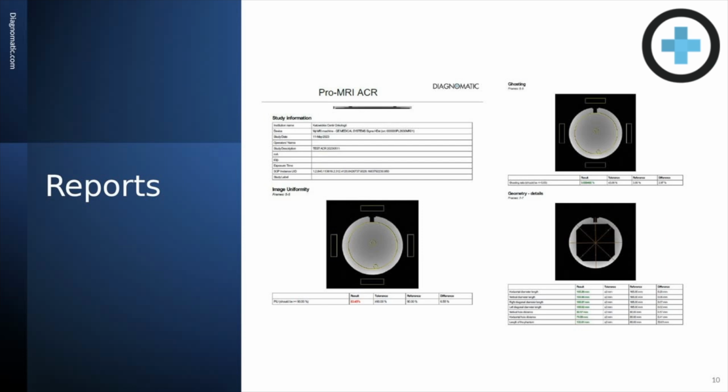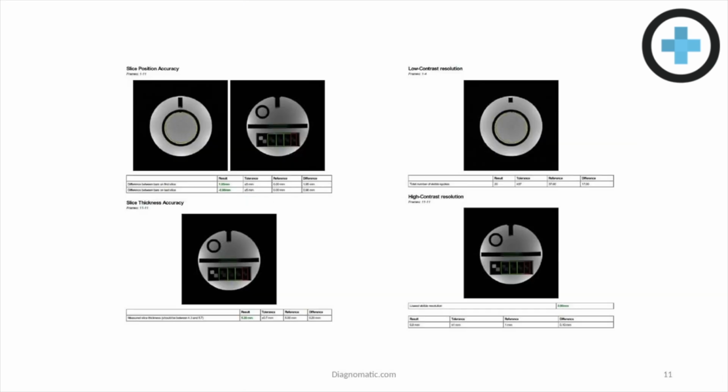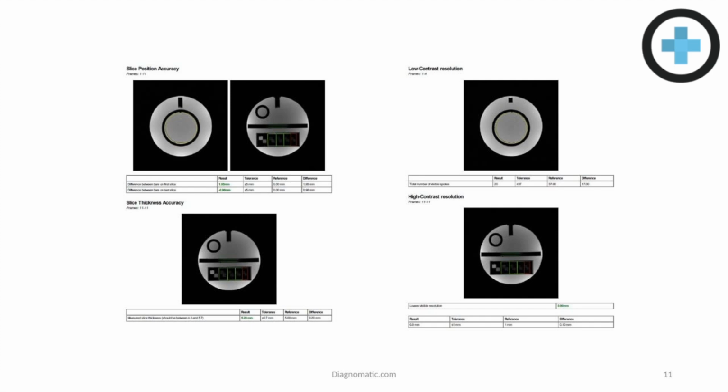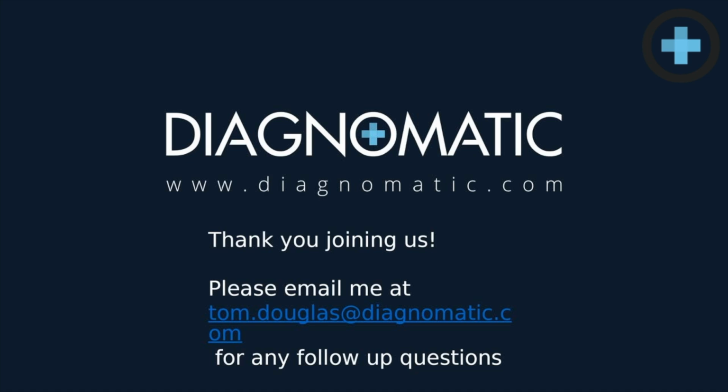As I mentioned, once you run that report, you're going to receive an email that breaks down each one of these tests, shows your scores, and gives you something you can have as physical documentation of each of your tests. So that's a brief overview here.